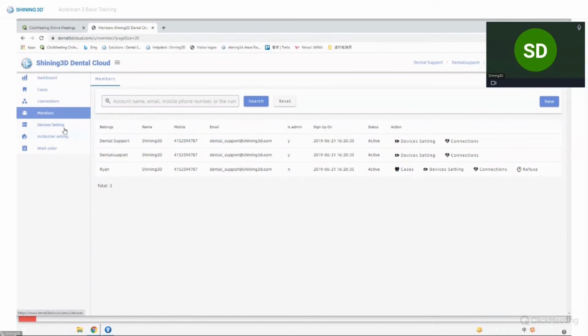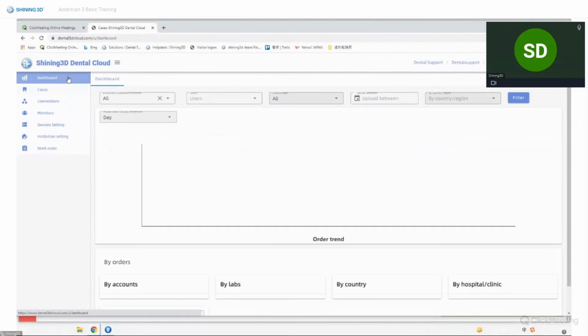Okay, this is my administration account, so I will not show this for you. So yeah, that is pretty much everything about Dental Cloud.